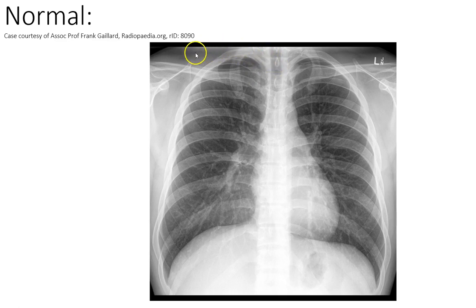Sometimes, particularly when somebody's unwell, the top of the film is missed off, but we'll try and do it that way for those who are interested. 1, 2, 3, 4, 5, 6, 7, 8, 9, 10. I think I must have missed one there. So 1, 2, 3, 4, 5, 6, 7, 8, 9, 10. It really gets a bit hard at the top.